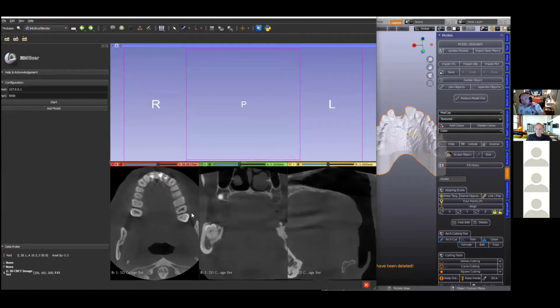But tonight, what I'm going to do is quickly explain how we can also make a volume render in 3D Slicer, and that's really cool, actually. And that's easily done.